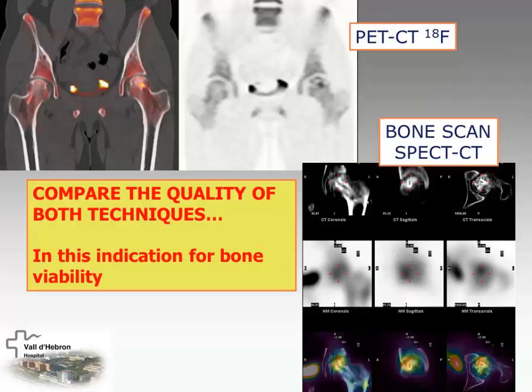Look at this case. This is a recent case on the left and on the top, and you can see in a young woman a reperfusion on the left femoral head, but in this case without a fibular graft. Here the technique has been just a forage through the femoral neck.